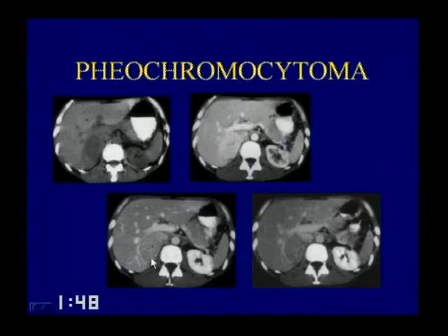This brings to mind something that has been described in adrenal adenomas. Adrenal adenomas, while they can be very hypodense pre-infusion, will show intense enhancement. They tend to wash out very briskly. In other words, if you put a density cursor on the adrenal gland and kept scanning further and further out, the contrast classically is described as fading very quickly. However, this pheochromocytoma has an identical washout curve in this particular case, which just emphasizes that the washout characteristics of adenoma are not a hard and fast rule.